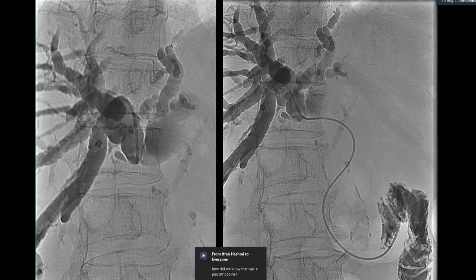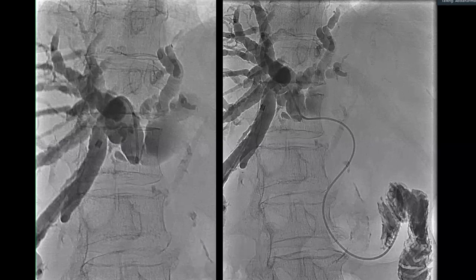So there's no history of surgery. No history of surgery. Right. So this abrupt cutoff could be due to some malignant mass or some extrinsic compression from the mass, which has caused this abrupt cutoff, since there is no history of surgery. What malignant mass is likely, sir? Cholangiocarcinoma would be my provisional diagnosis. And differential could be some hepatic malignancy, which might be compressing at this level and causing the stenosis. Okay. All right. Excellent.